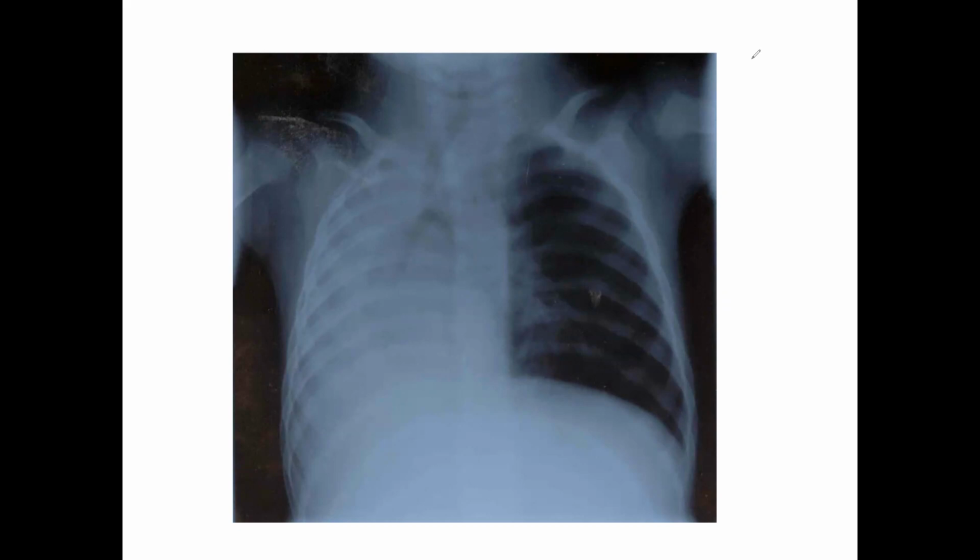If something shows up more radiopaque, it's going to have a shade of gray or white to it. So your bone, fluid, fat, anything of that nature would show up more radiopaque, as opposed to your air-filled spaces, which will show up more radiolucent. Radiolucent shows up more dark, while radiopaque shows up as various shades of gray or white.